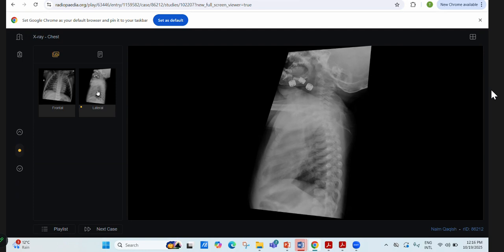I need to check with the radiographer whether these are artifactual or projectional. Yes, these are artifactual. There is mild adenoid hypertrophy. The rest of the upper airway appears unremarkable. I'm unable to clearly define the lower airways, but the left lung haziness is redemonstrated on this X-ray.